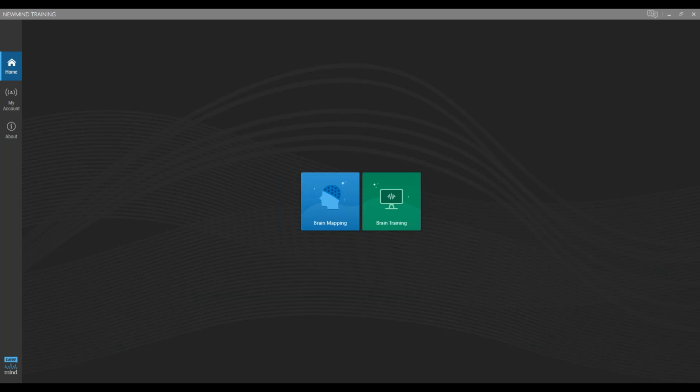So I kind of had to figure out, and that's one thing I love about the New Mind software is that it blocks all that out. So you're actually going to get a good training session.